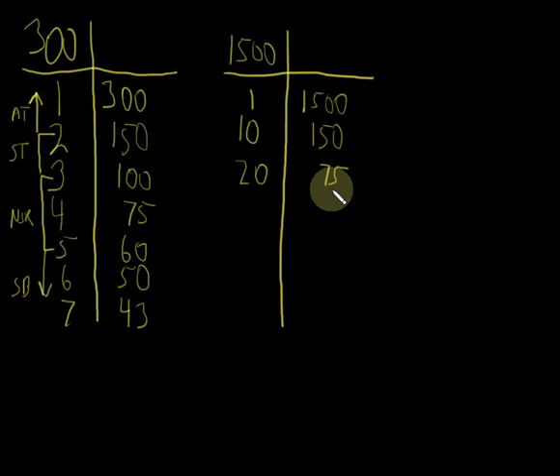Now, the computer compensates if the heart rate is irregular, meaning if the beats are not equally spaced. While it's far from perfect, you can kind of look here and see the numbers 300, 150, 100, 75, 60, 50, 43 are written about the same size. That 150 got a little big, but generally speaking, these are about the same distance apart.